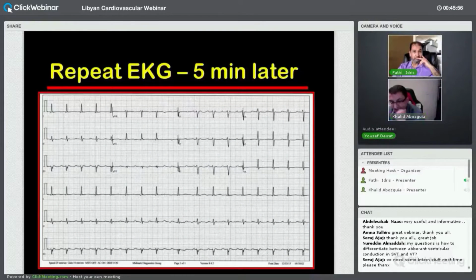If the answer is yes, then you still didn't answer the question. So it's not as easy. I'll be honest with you. Even electrophysiologists cannot be 100% sure to establish whether this broad complex tachycardia is VT or SVT with aberrancy. But let me ask for the beginner, basically for someone who's learning EKGs.